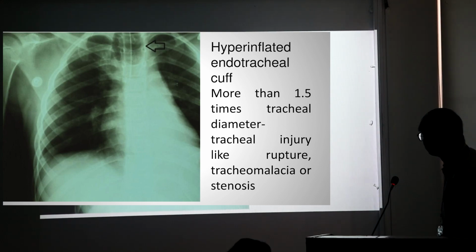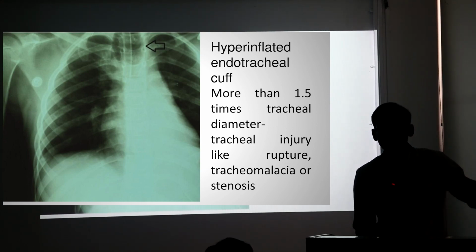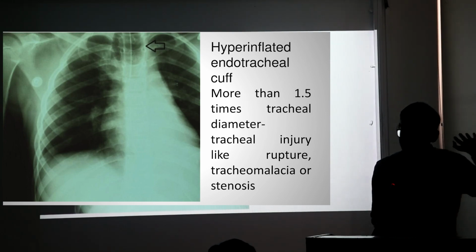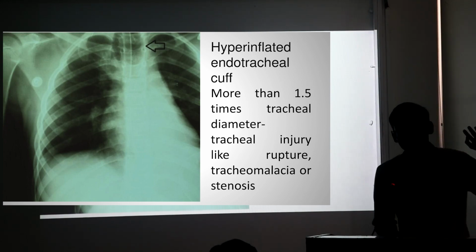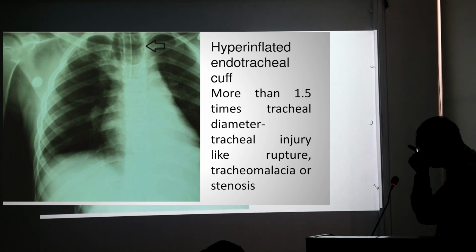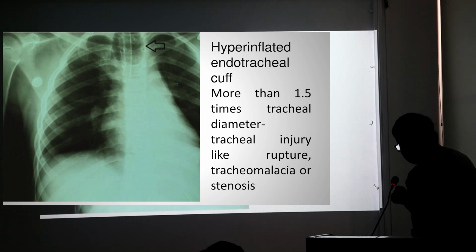Okay, so the pointed arrow. I have already told you, in this session we are dealing with only 3 colors: black, grey and white. So too much black is what? Air. So what is happening over here? The pointed arrow, you have your answer in front of you. Can you see the shape of the marking? Can you make out the black area where I have put a pointer? It's round in shape. And what is over there?